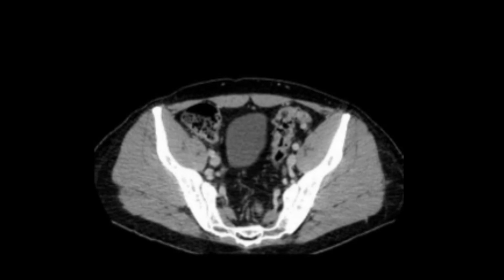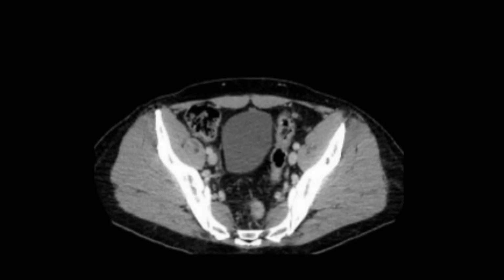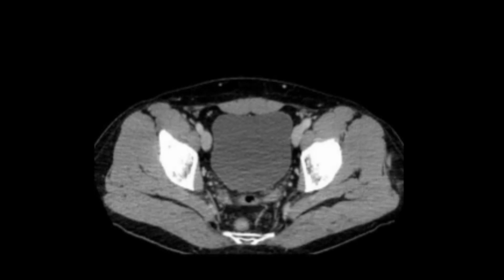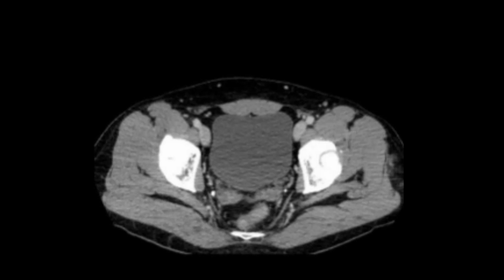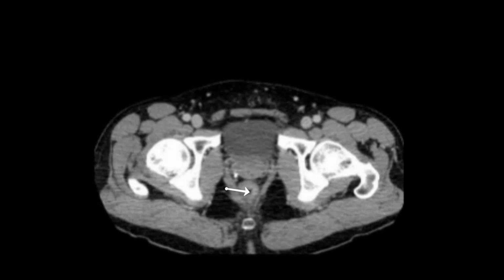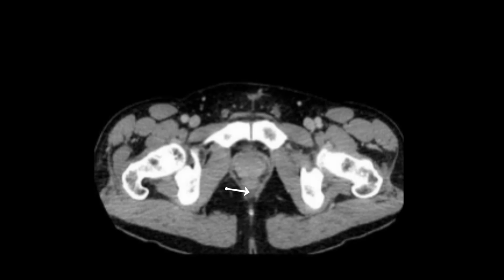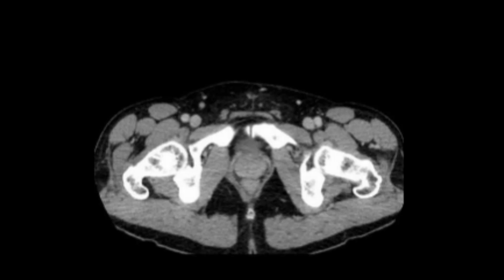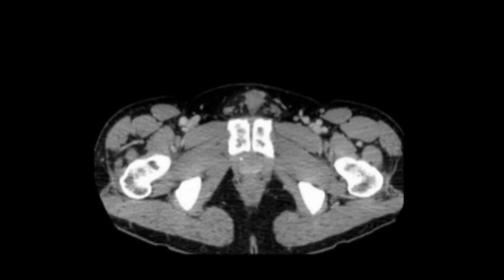Well, as I scroll further down, I see how the descending colon on the left side runs down and makes a loop here. And you remember, as soon as we have the hip joints on both sides, here they are, we can identify the rectum. So this part of the GIT which we have here is the rectum, and it continues until the symphysis pubis. Now we do not have rectum anymore, but we have the anus. In alive patients, the anus is closed because the muscles which we have here, the internal and external sphincters, have some tone and contract.